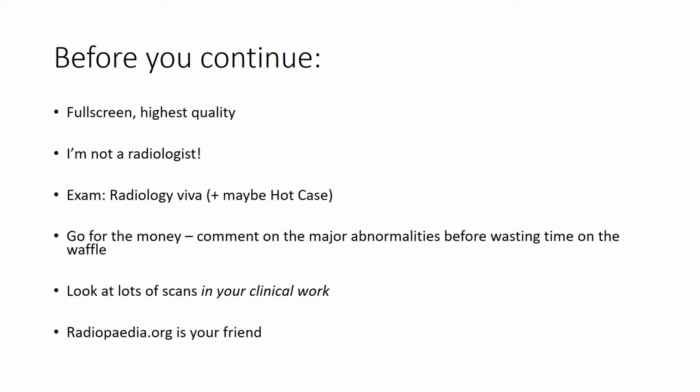Before continuing, I'd suggest viewing this talk in full screen at the highest quality you can. There's going to be a lot of images and usually multiple images per screen. I feel obliged to preface these talks by disclosing that I have no particular expertise or special interest in imaging, especially not of the abdomen. All we're trying to accomplish here is to tick off a bunch of the big ticket items that you'll be expected to identify in the exam.